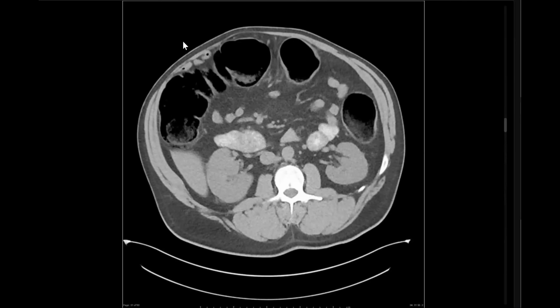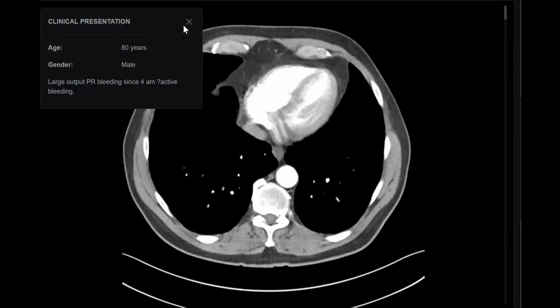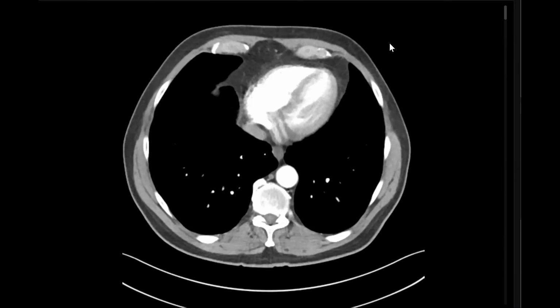Nice, my friend. Another case, but this time the patient presented with rectal bleeding. Before I give you this case, what are the expected causes you should look for, arterial and venous? In old age with rectal bleeding, first cancer of the colon. Also angiodysplasia of the colon. So what else will I check? Look at this case and tell me what else, because there is another cause. Okay, you can proceed.